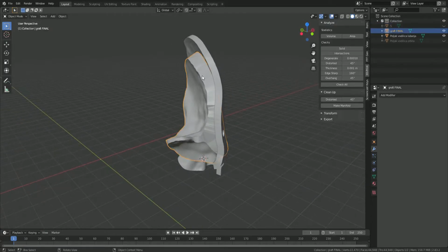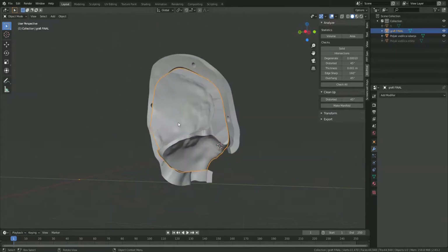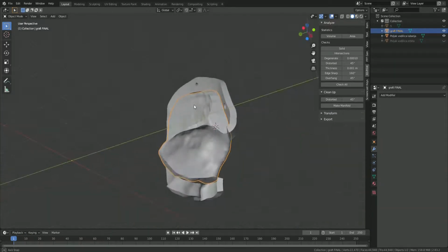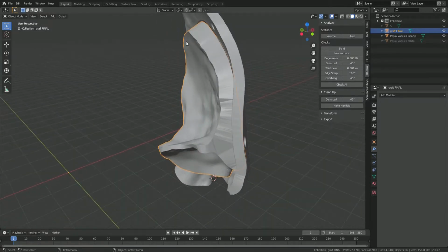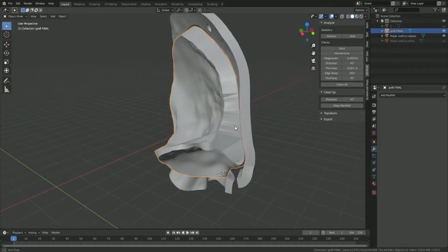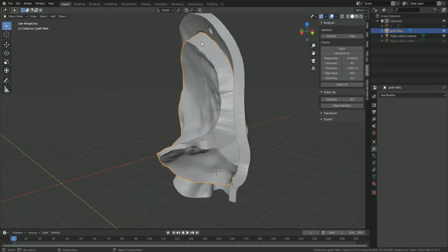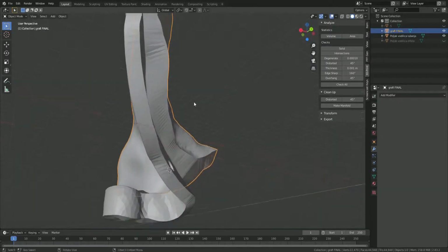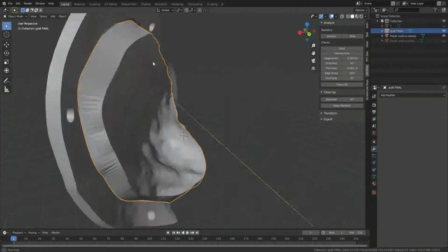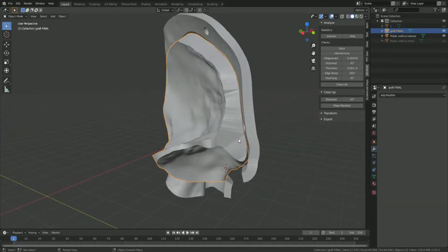because the next step is to make a mold for this graft. So I think it will be hard to have that kind of model, because I want to make a plane of the two parts, somewhere here, between the inner and outer tabula.